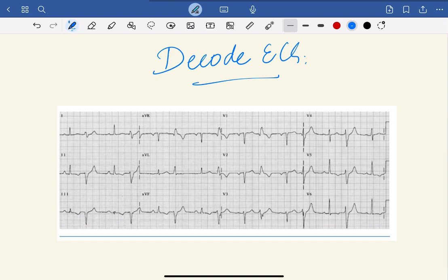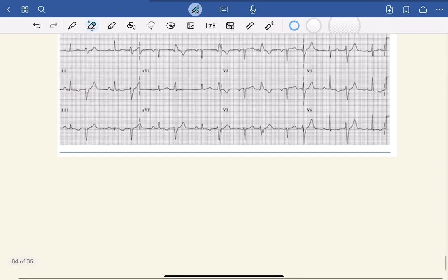So if you see this given ECG, you will find strikingly that there are wide QRS complexes superimposed on normal sinus rhythm. So this is your sinus impulse and these are your wide QRS complexes, bizarre shaped wide QRS complexes which are not preceded by P waves. There is no P wave here. So these are nothing but your PVC.